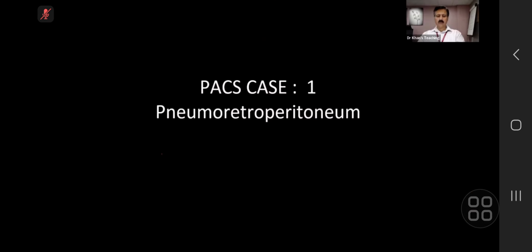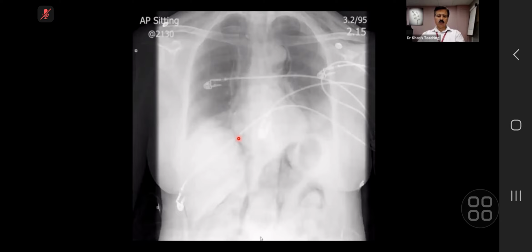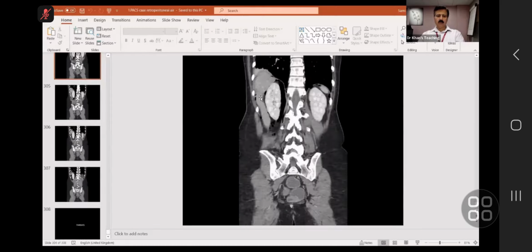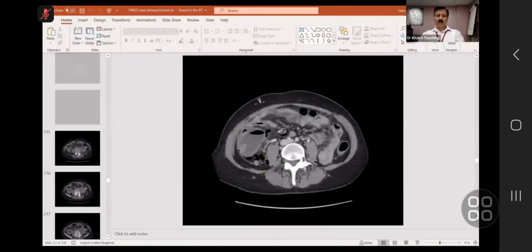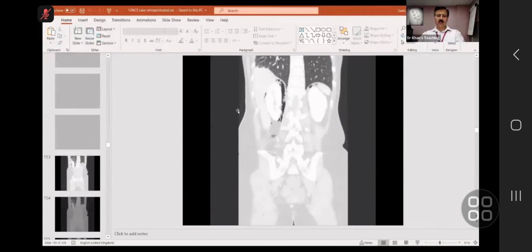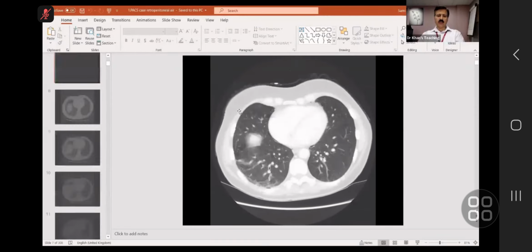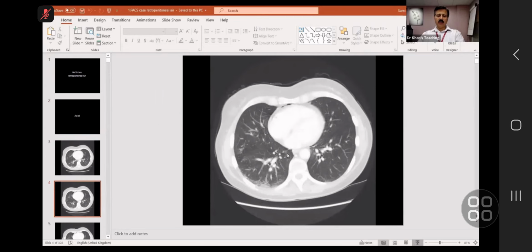Now, I will show you a case. I'm showing you this case just to develop your concepts and your eyes on the concept of pneumomediastinum and retroperitoneum, etc.